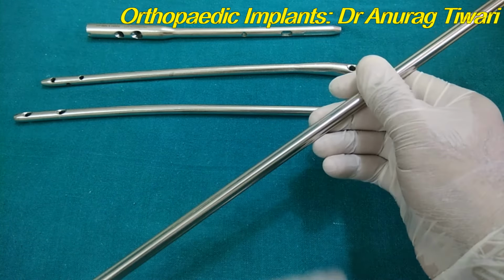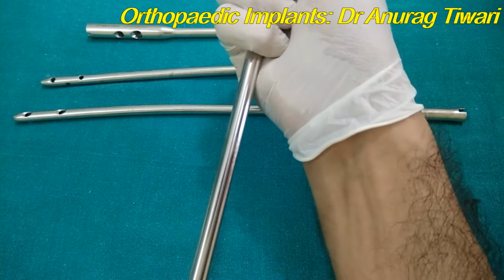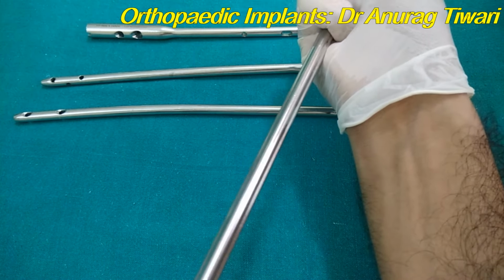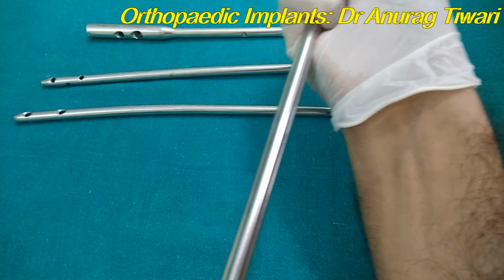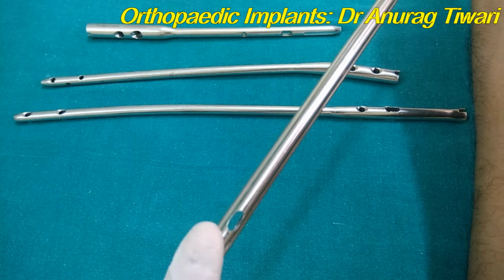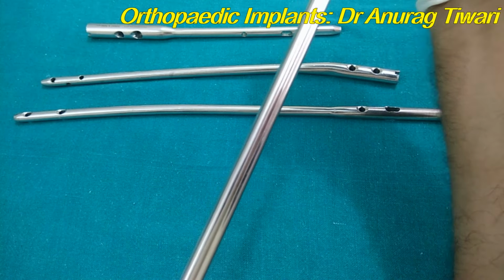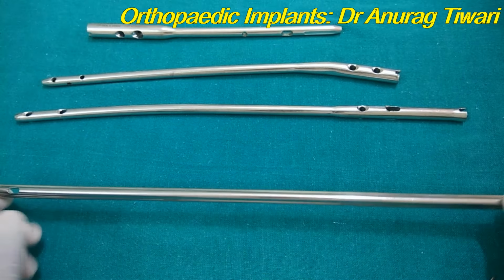So it is when you are going in the proximal fragment. This eye goes into the proximal fragment bone, and now it got stuck. It is not progressing further. So in order to remove this nail now, this eye will be helpful, because through this eye you can extract it again. So this is the purpose of the two eyes at the two ends.